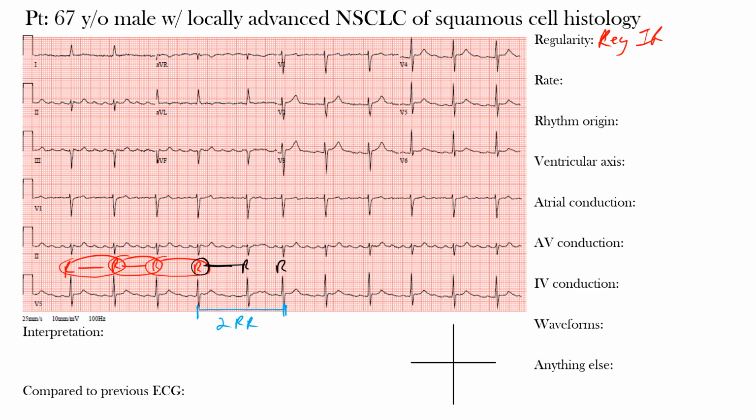Now, if you were to look at just the P waves here, you could call it a regular rhythm because all the P waves occur at regular P to P intervals. So when we look at the R waves or the QRS complexes, you could say that's a regularly irregular rhythm. We'll put that here, the QRS complexes. However, if you look at the P waves, one of the best leads to look at is lead 2. So if you look right here, here's lead 2, the rhythm strip.